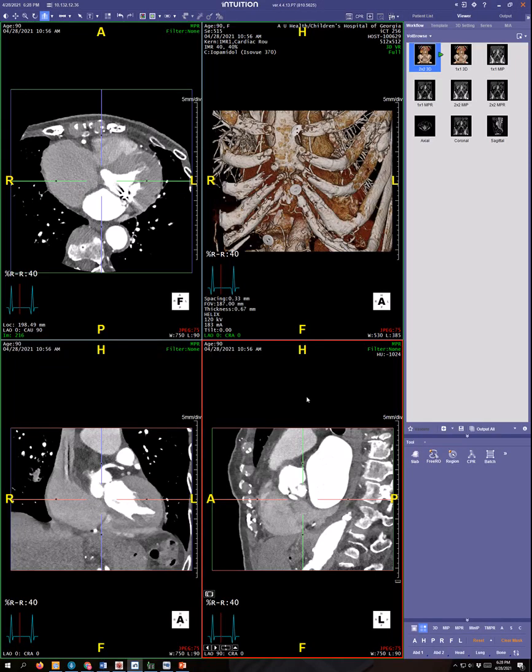I'm going to post-process a TAVR case. I've not opened this before. All I did was hide the patient information to make this HIPAA compliant. I'm going to call out the buttonology as I do it.